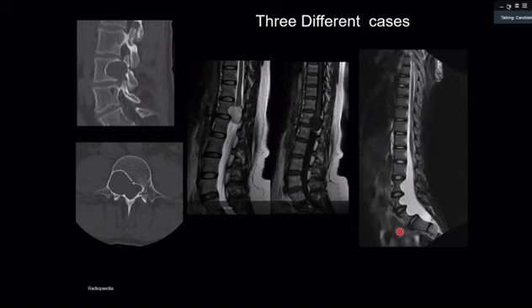The cord also seems to be terminating early. It should be far downwards than this. I'm not sure if it's because of the image. The intramedullary lesion is causing focal posterior scalloping of the adjacent vertebral body.